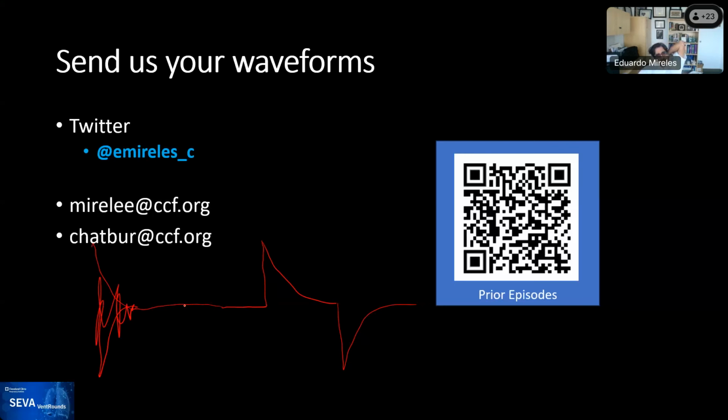A failed trigger you would see during expiration. If you're looking at the flow, you would see the flow moving upwards, trying to cross the baseline and not achieving a breath. So failed triggers occur during the expiratory phase. An early trigger is usually a mandatory breath followed by evidence of patient activity.